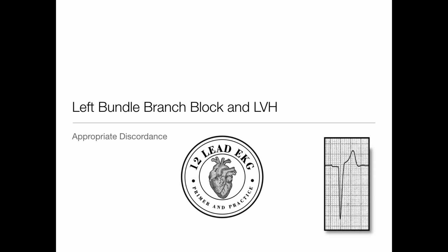So appropriate discordance. This is what we see in left bundle branch block and left ventricular hypertrophy. In other words, when we have those deep S waves, we see ST elevation and upright T waves in those leads. And that will be a cause of ST elevation.